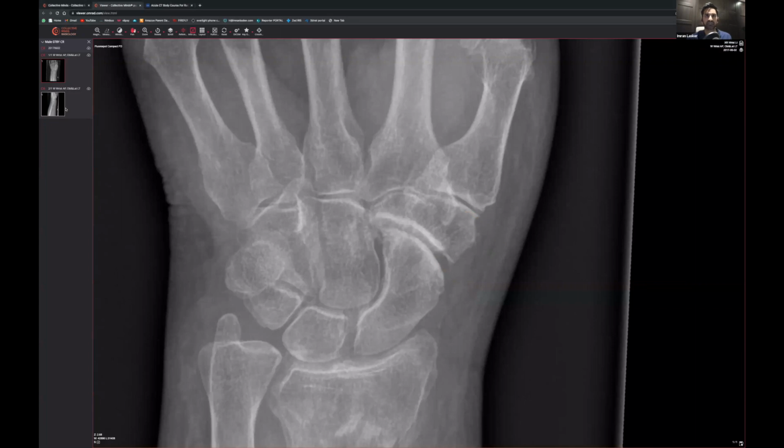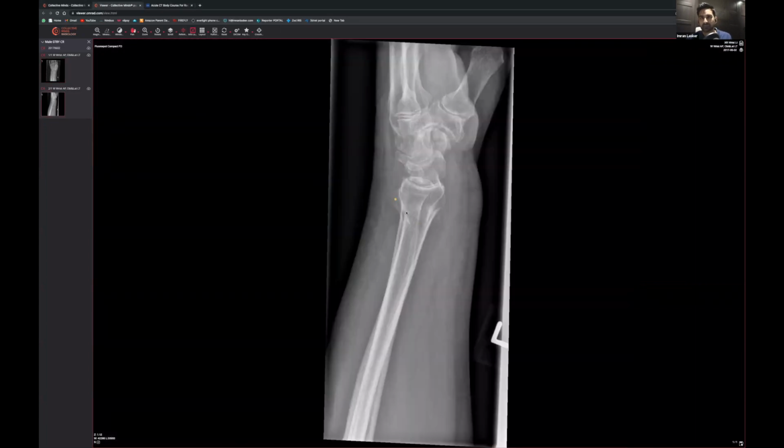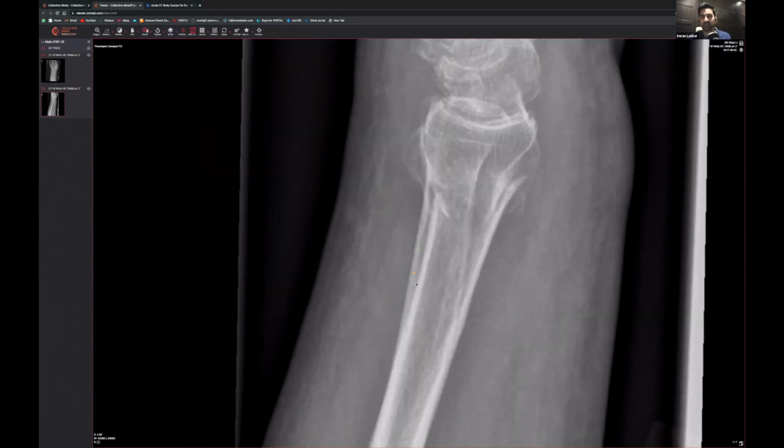And then we just check this area as well, just to make sure there's no other fractures. Here you can see, this is sometimes the only view you get in exam cases anyway. You do want to follow the line all the way along, and just see where it leads to, see whether you can see the fracture.